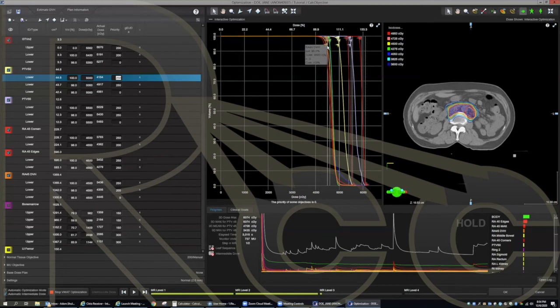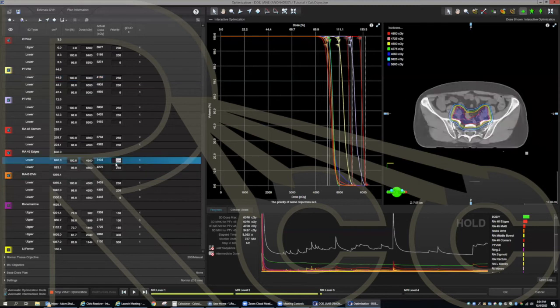Some people have different methods. This is how I'm going to do it. Or you can increase these values. So maybe I'll do both. Increase these priorities, then maybe I'll mess with these doses by like half a gray here or there. The other thing, you can see the body is still working harder than everything else. That's my NTO. If this starts to drop in priority too far down, that means I could have dose spillage. So I'd probably up it in this normal tissue objective. So if I get up to like 300 priority on these things, then maybe I'll have to up this normal tissue objective as well. Or if you don't have that, then you would up your ring values.